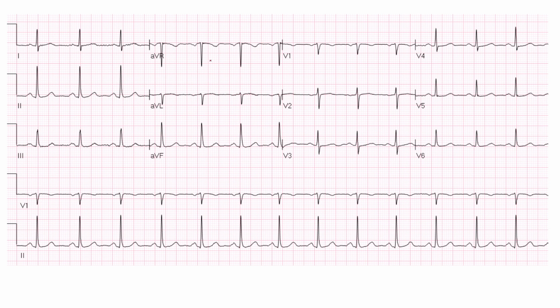First of all, you'll check the patient name, the details, everything. You'll check calibration. We have calibration here. For example, let's take this one. It's 2 large boxes, okay? This one is 2 large boxes, which is 10 millimeter, which is the normal standard. And the speed here is not written, but most of the time it will be written in the left corner, 25 millimeters per second, or it will be written down below. And this is normal. Then the first thing, is it regular or not?